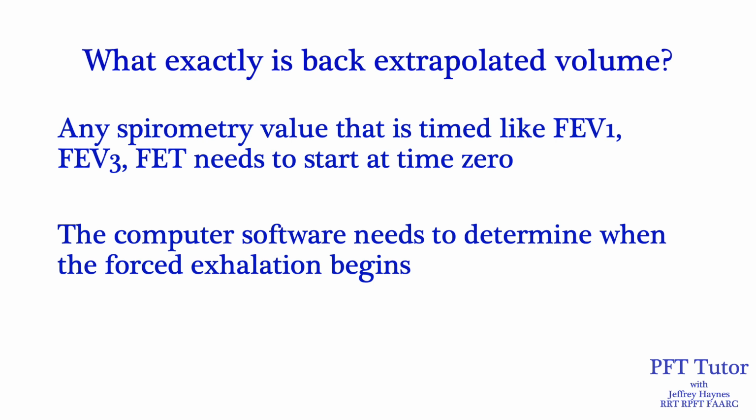The first concept to understand is that any spirometry value that is timed, like the forced expiratory volume in the first second, FEV1, or others like FEV3 or the forced expiratory time, needs to start at time zero. In other words, the computer software needs to determine when the forced exhalation begins, and that will be time zero.